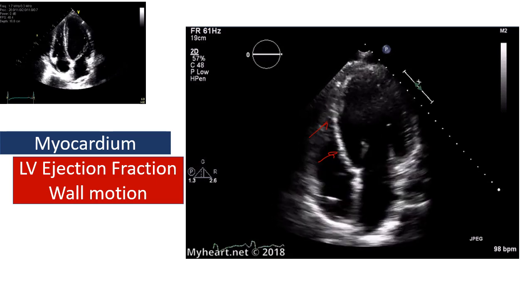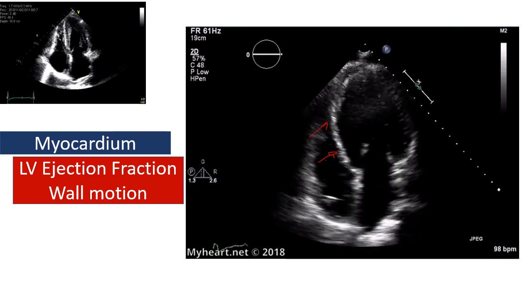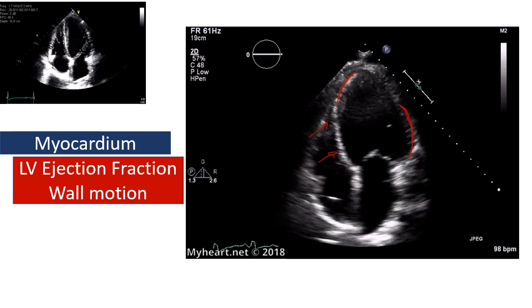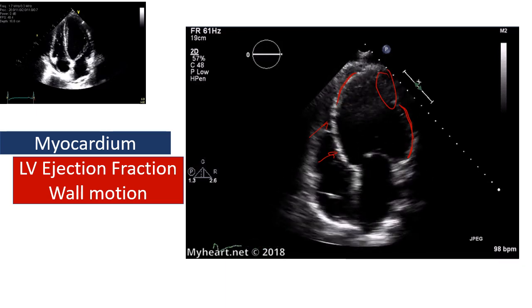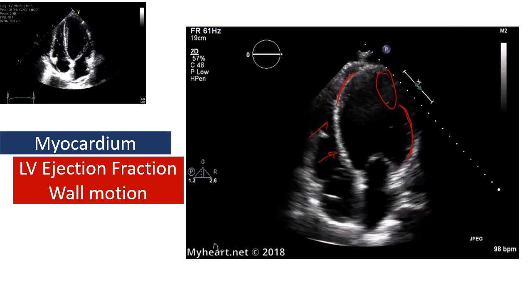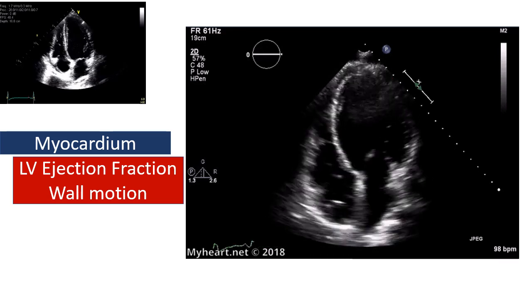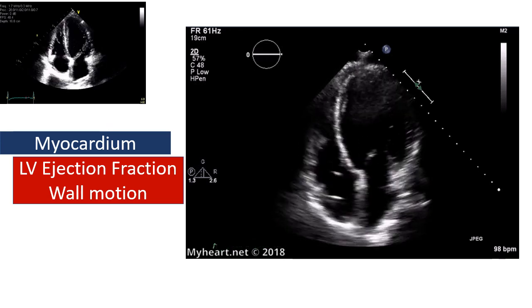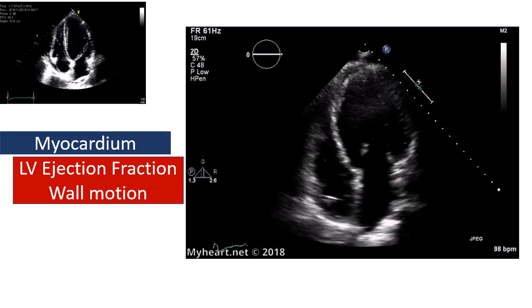They are thinned out, they are not contracting at all, while there is hypokinesis in the apicoseptal region and in the basal and mid anterolateral. And the best moving here is the apicolateral. This is the most spared part in this diagram. So there is significant regional motion abnormality, and it's very evident that the ejection fraction here is low. The contractility here is not very good.